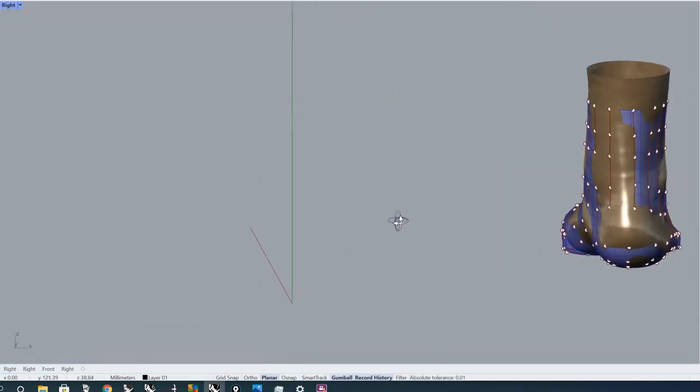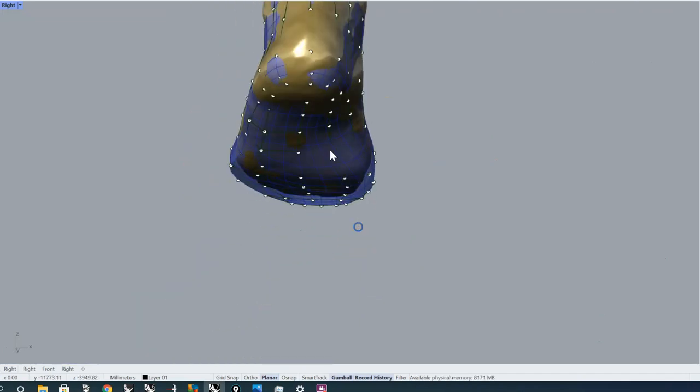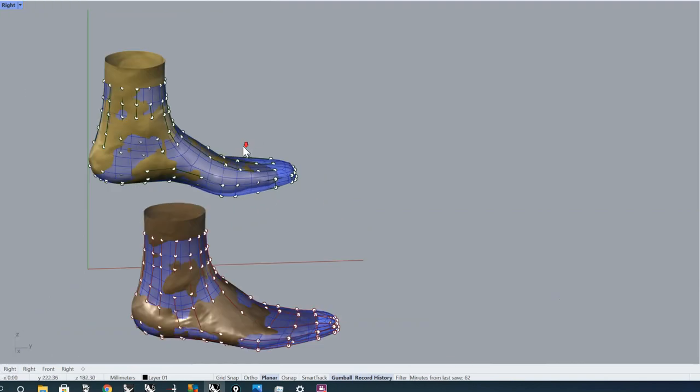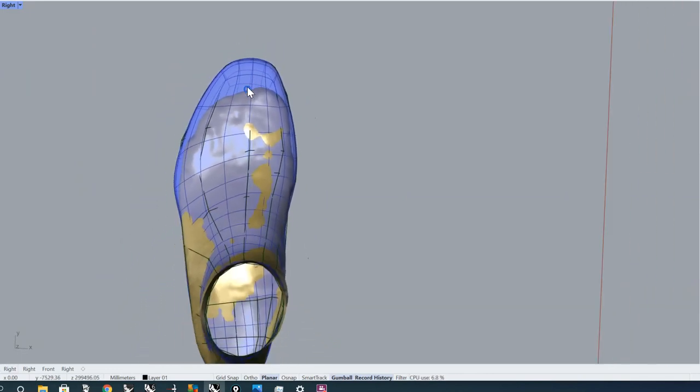But there are still a few things that I'm not happy with. Here the ankle, maybe around the heel, maybe some small things. So maybe this is a good moment to switch to an even more detailed level of the last itself. Therefore I have to leave this blue last, bake it, because as you could see in my earlier video, this blue last is the last that has been generated by Grasshopper, so I have to bake these lasts.